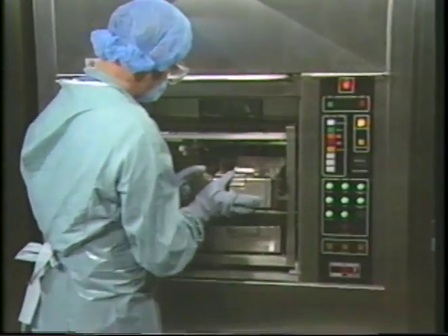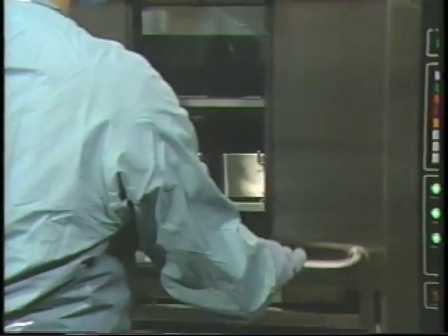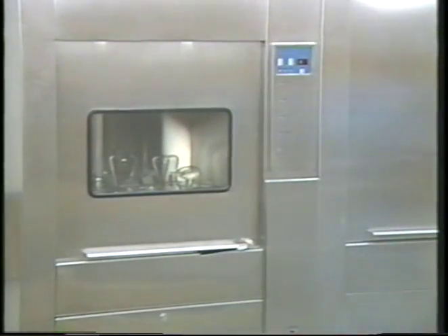Loading should occur from the bottom up, while adding appropriate shelves or accessories above each layer as determined by the manufacturer. If some items are higher than others, they can be placed on one half of the chamber, leaving space above for other items as long as appropriate coverage and draining occurs.